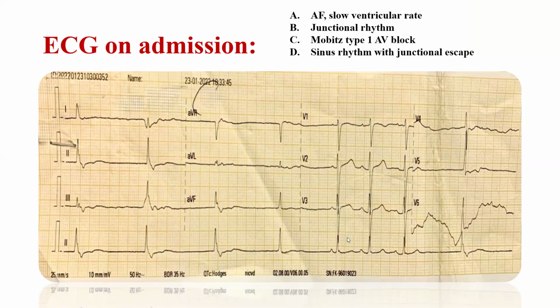So, Tushar, should I describe the ECG before anybody comments? Explain your comment, and then I'd like to request Dr. Abdullah Jamil sir to give his assessment on this ECG. First, you say what you want to comment on this ECG.